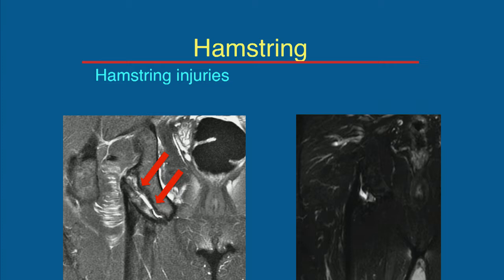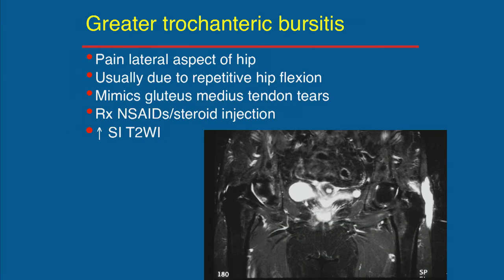In this example, I have to say that we get a lot of requests for evaluation of sciatic disease and lumbar spine studies, but what is underappreciated in many of our adult patients are these high-grade partial tears of the hamstring, which can present as annoying butt pain, often interpreted as sciatic abnormalities. So two different appearances of hamstring abnormalities.